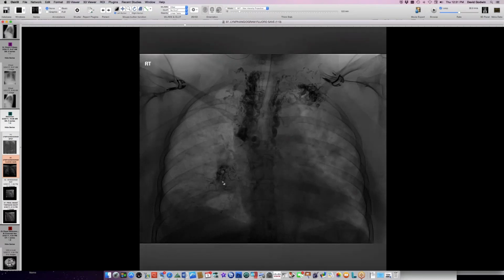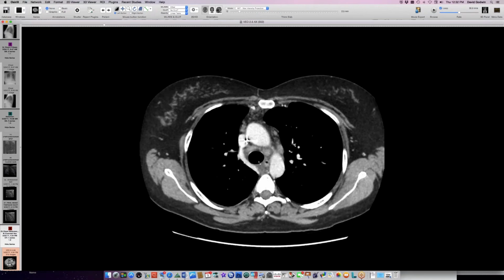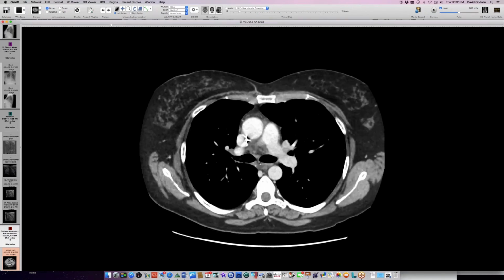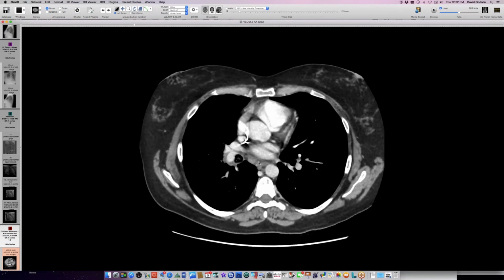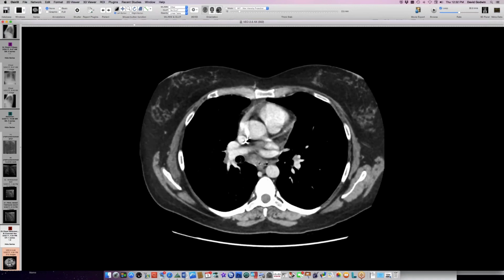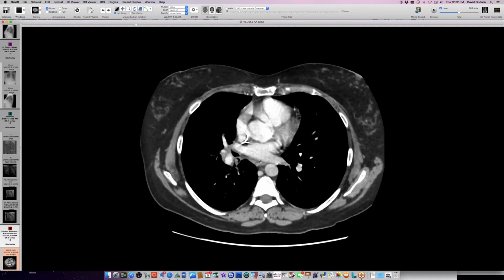I was concerned on the CT scan that this person had a lot of mediastinal lymphadenopathy because there's all of this fuzzy stuff throughout the mediastinum. I thought this was a case of lymphoma, with lymphatic involvement, and that this person with a clinical diagnosis of plastic bronchitis had plastic bronchitis secondary to lymphoma with obstruction of lymphatics.